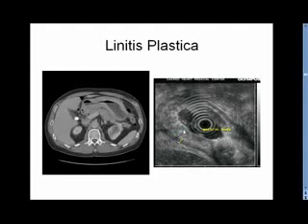As you know, it's really hard to get diagnostic biopsies because the tumor cells are mostly located in this layer, and you don't get deep enough even with big biopsy forceps. It may be difficult or impossible to get a diagnosis, and often a full thickness biopsy is required. But if you have this appearance, that's enough to refer the patient for laparotomy if this is what you want to do.